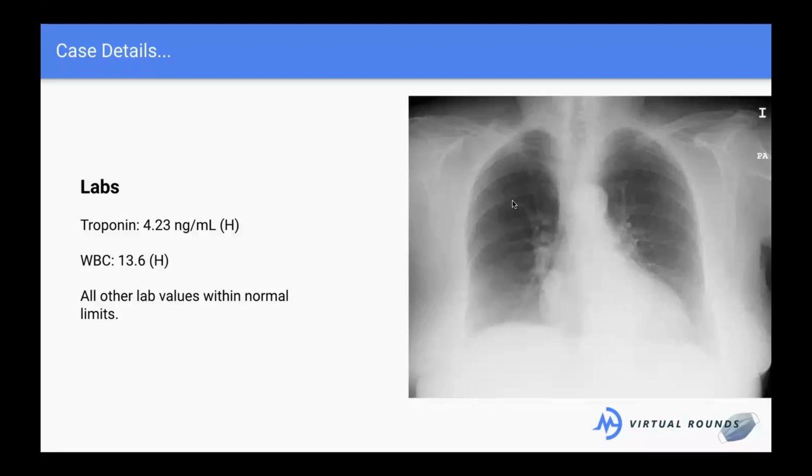How about the lungs? Is this how a lung should normally look? This is a hard question if you haven't seen chest x-rays before, but just looks kind of foggy. I agree. So this is kind of a congested looking lung. We'd like it to be more black. We'd like it to be filled with just air. So there's kind of something backing up here. Heart's not pumping appropriately. Mr. Jones is still feeling pretty sick, maybe even looking worse. So his chest x-ray doesn't look great. He's got some bilateral infiltrates.